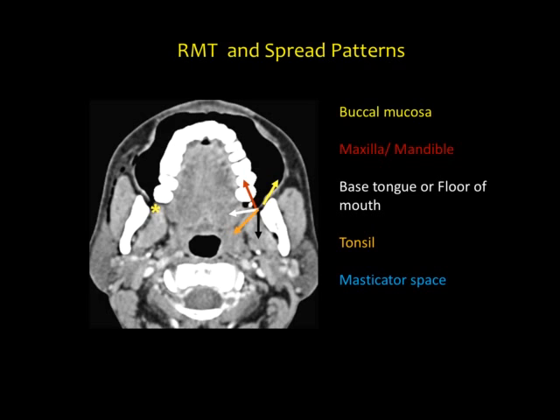Perivertebral will include prevertebral and paravertebral, both. So any node in the retropharyngeal space is a significant node, even if it is small. Nodes are not normally seen in the retropharyngeal space.